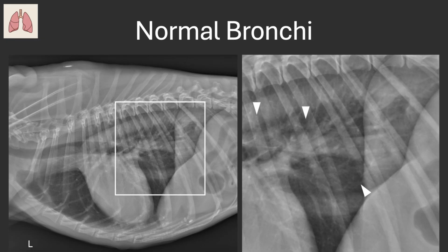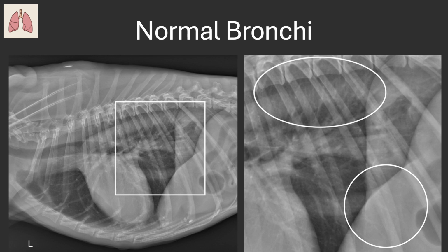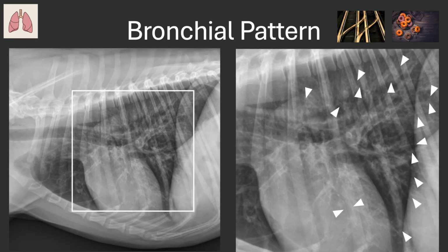Some peripheral bronchial walls are occasionally identified due to tangential imaging or thickening due to current or previous disease as noted by these white arrows. Tangential imaging may occur when the X-rays are more attenuated by bronchial walls due to the angle at which it hits the bronchial walls, such as with end-on bronchi. This does not tend to be a predominant feature of the lungs of normal patients, especially in the periphery of the lungs as denoted by the white ovals.